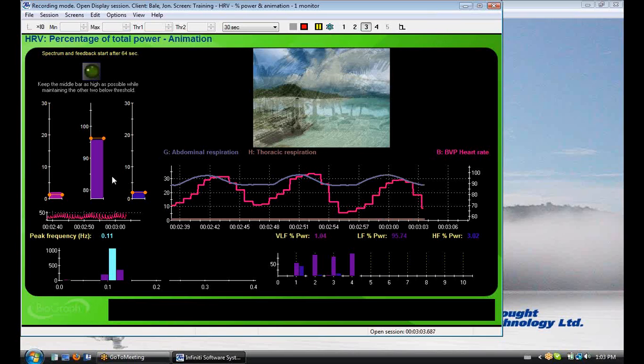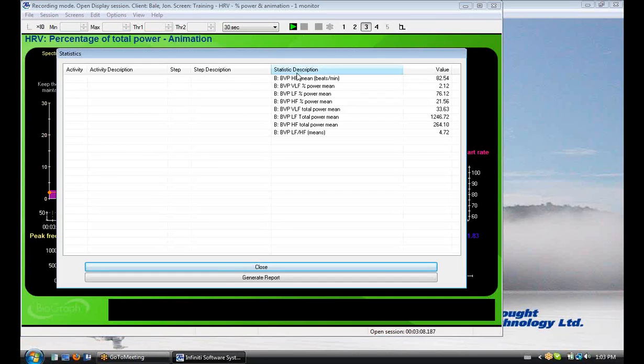Now that's all we have time for today. I look forward to speaking to you again in our next demonstration, which is going to be on how to interpret the statistics that we see here and how to understand using trend reports improvements from session to session.